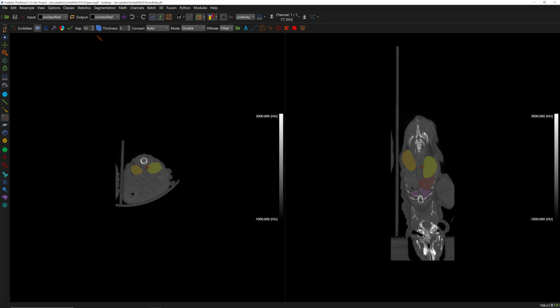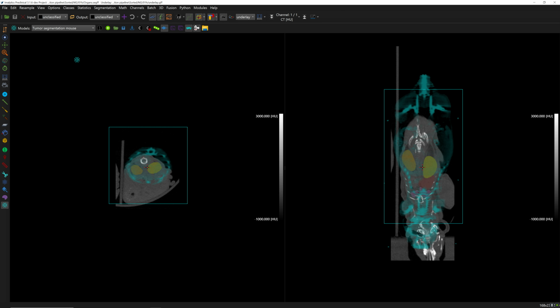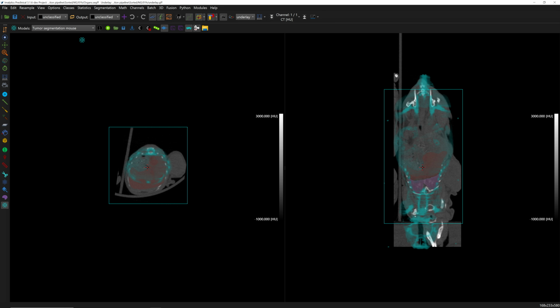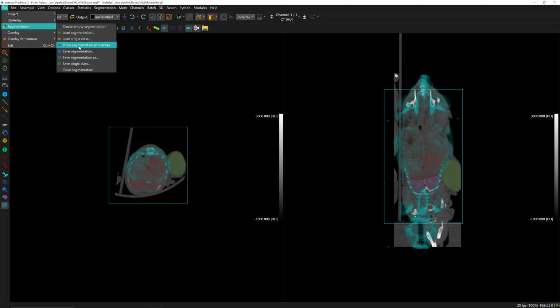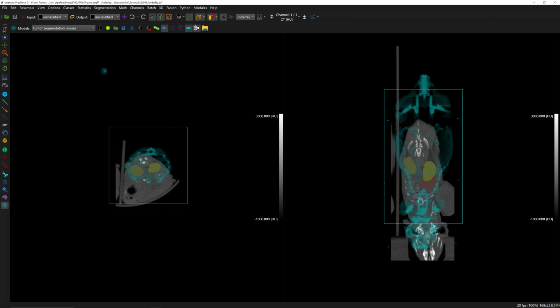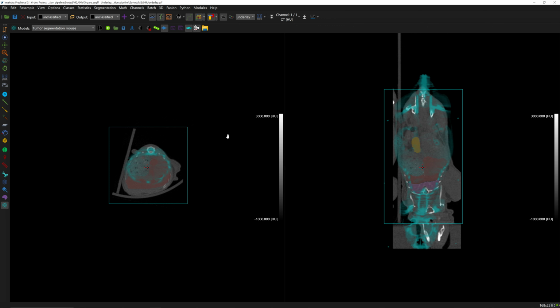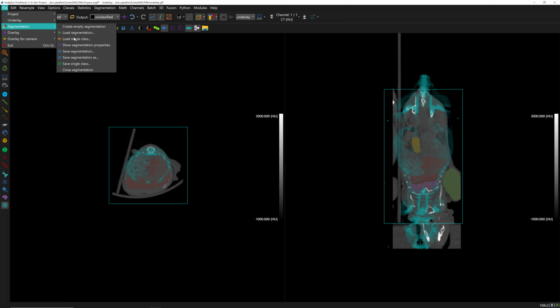And that's how you could do that. So I'll just quickly create the tumor segmentation, load the atlas file, save, jump to the next one. Of course, you should check all of them, it just takes a little bit of time, so I will not do that now for all of them, but I will add the tumor segmentation for all of them.